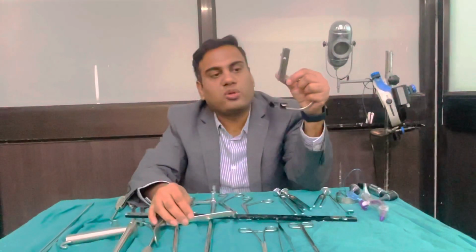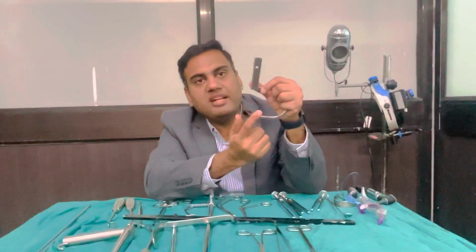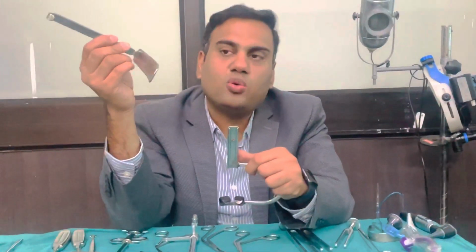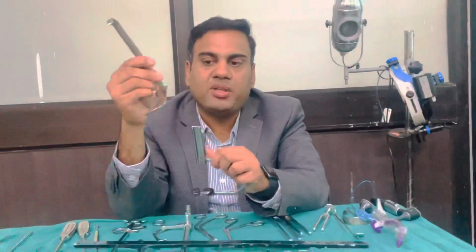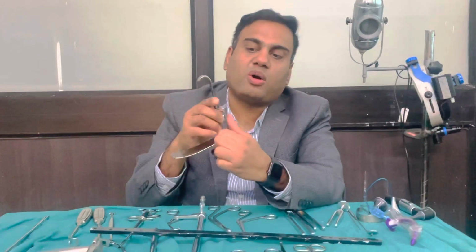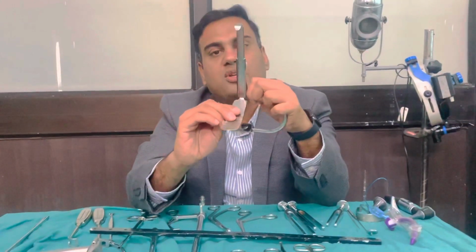This is a Boyle-Davis mouth gag. Again, like the scope, the hook end, or the leverage of this instrument, is going to be the upper central incisors. So this is going to remain in the mouth, and this is a tongue depressor. There are two types of tongue depressor. There can be a tongue depressor with central perforation, which will keep the endotracheal tube in place, or the one like this. The handle of this will engage in the Boyle-Davis mouth gag, and there is a lock system here, so we can fix it at whatever level we want, according to the mouth opening we want. So this can be adjusted.